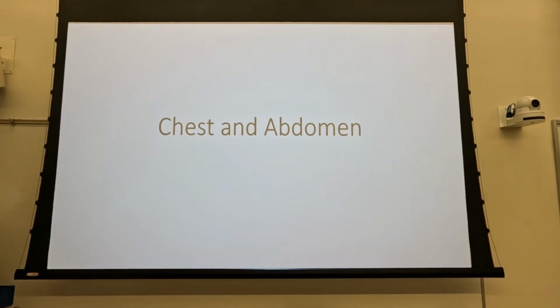And last semester was all about technique, so looking at your S number, index number, and kind of evaluating that and determining what you needed to do to correct for that. And this semester is all about positioning. So that's where we are in this semester.